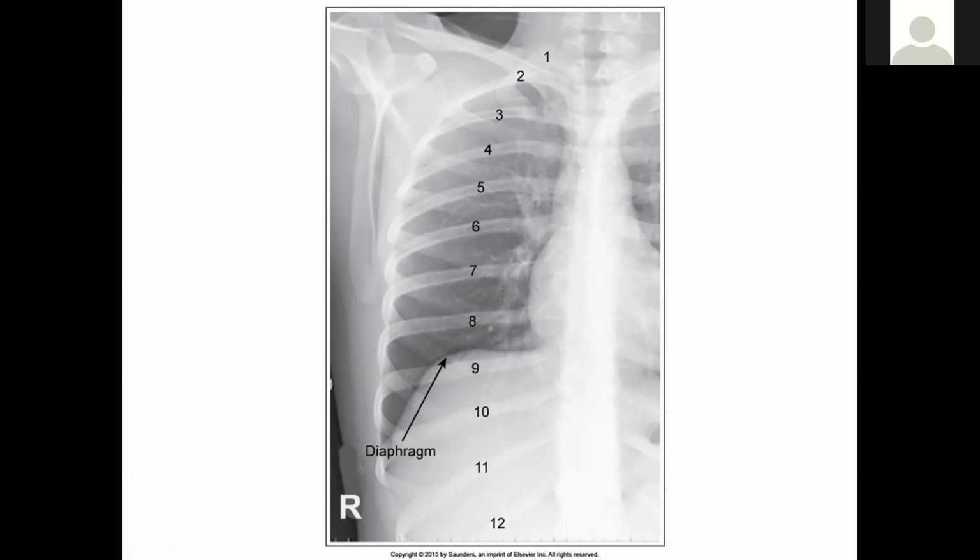Collimation, we could improve collimation on the medial side. We just need light to the spine or the sternum here, because the left side is not the area of interest. Some sites will want a BB marker on your patient to mark the site of the injury. That's what you're seeing here.